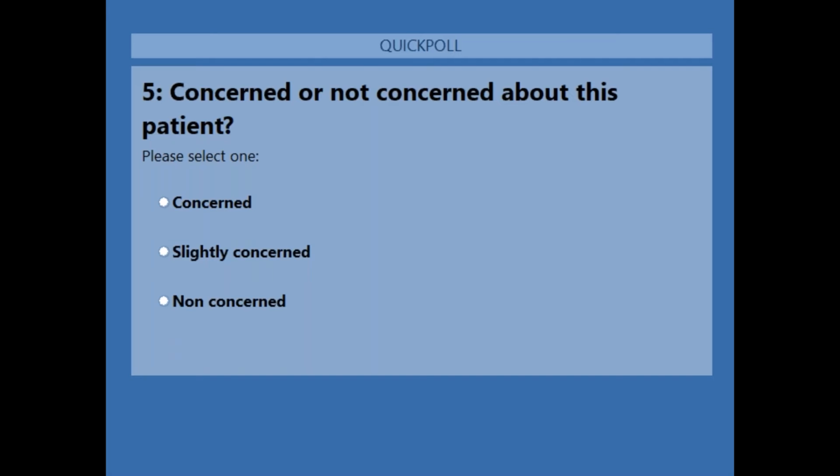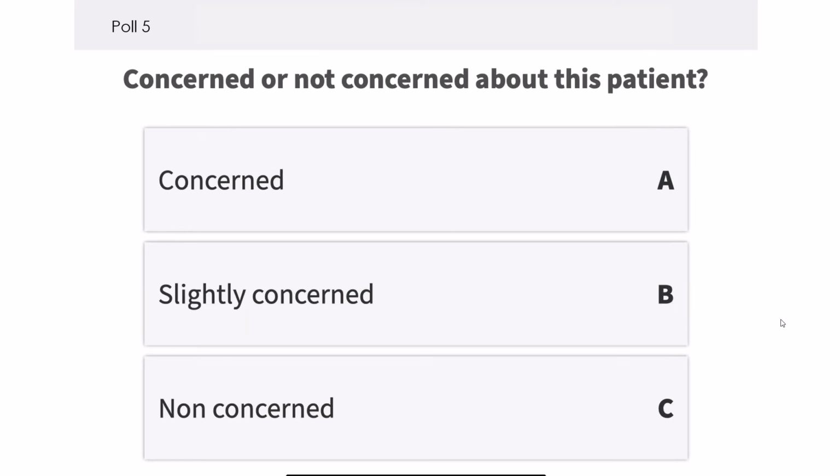All right, case number 2. Adam, for time purposes, let's go ahead and close case number 2 and look at our percentages. I'm guessing they're a little different. They are 28% concerned, 68% slightly concerned, and 5% not concerned. Adam, never wrong to be slightly concerned, right? Right on the fence. We could go either way on that. So that's exactly where I was as well on this. This is one of those, should I watch? Should I not? Vision's down a couple of lines in one eye.